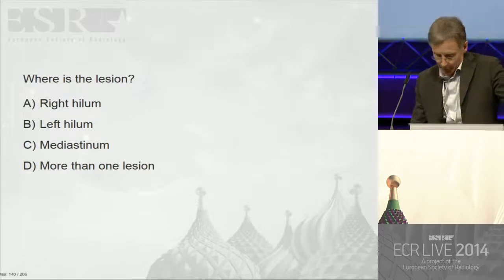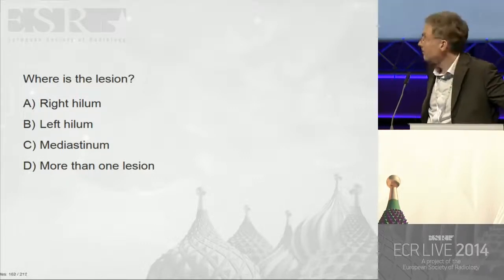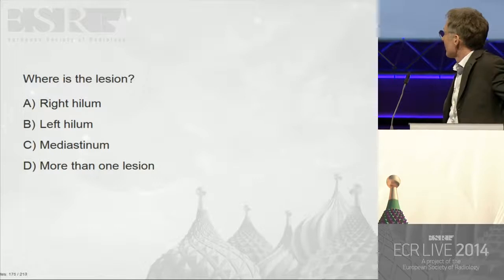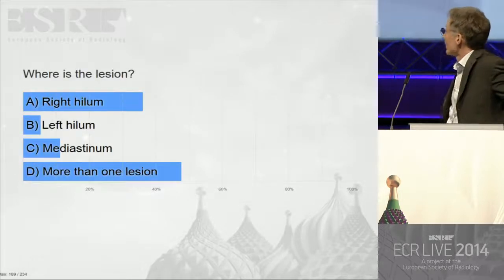I can go back and show you the film enlarged if you like. So: right hilum, left hilum, mediastinum, or more than one lesion. Let us see the results, please. Okay, more than one lesion.